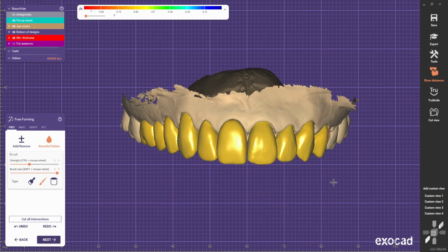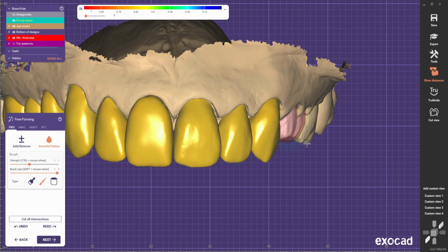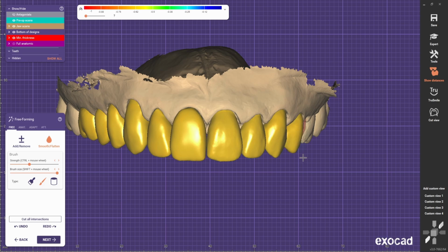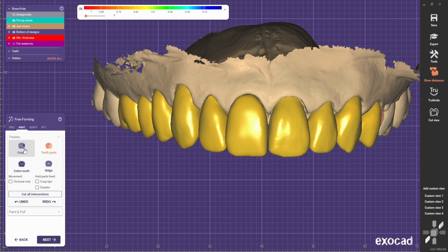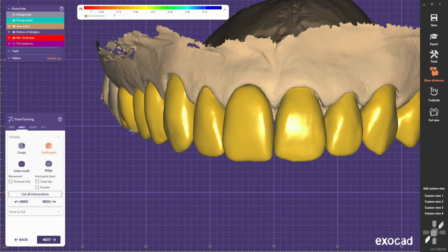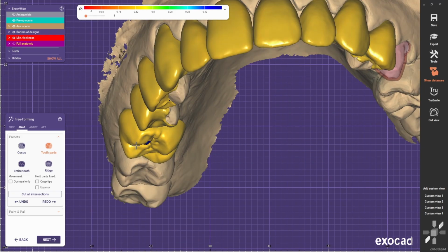For those who don't know, usually the first molar seen from the front looks like this, in which the distal cusp comes a bit more down than the mesial cusp and is a bit more out than the mesial. So usually it looks like this. Aesthetically, usually doing a smile design, we don't really do it like that, but we can always just make an indication very slightly of how it should really be. Something like this.